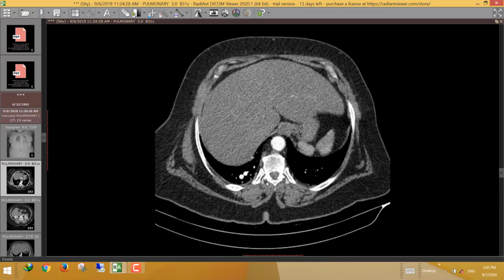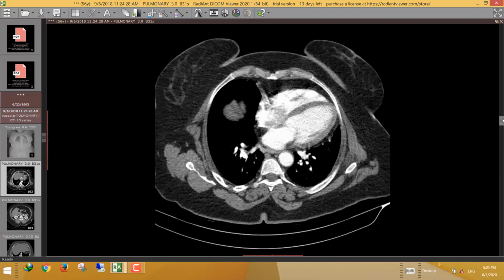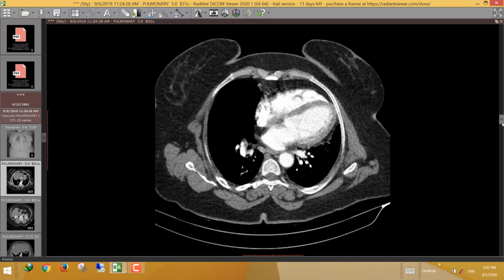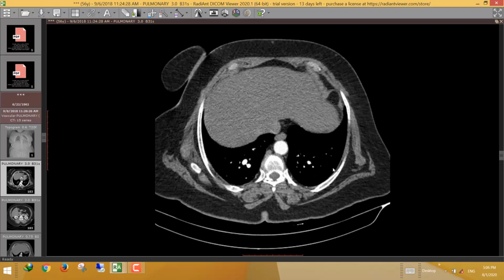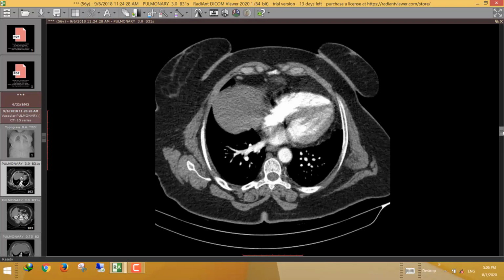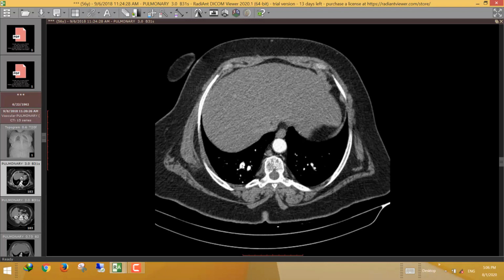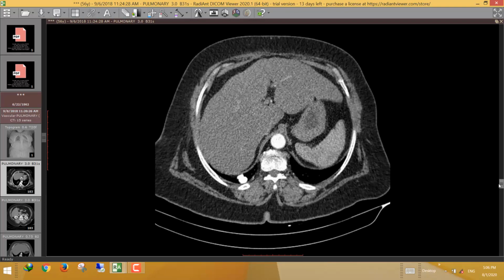And we can see here the draining vessels or supplying vessels. We can see here one of these vascular supplies is arising from the pulmonary artery, the right pulmonary artery here. This is the arterial supply, and this is the venous drainage that is draining via the inferior pulmonary vein. So this is the vein and this is the artery, and both are enhancing and hypertrophied in the same phase, indicating that there is an arteriovenous shunting.